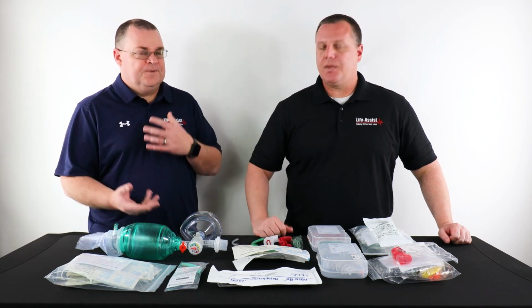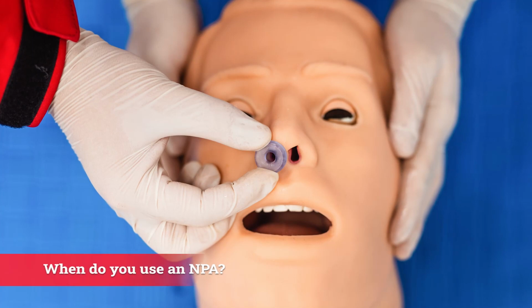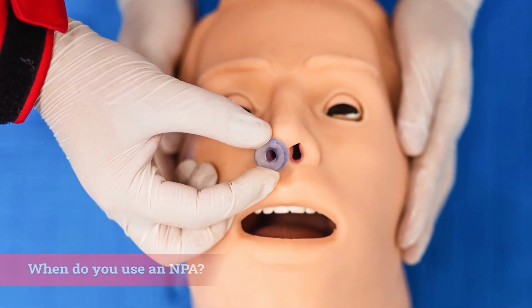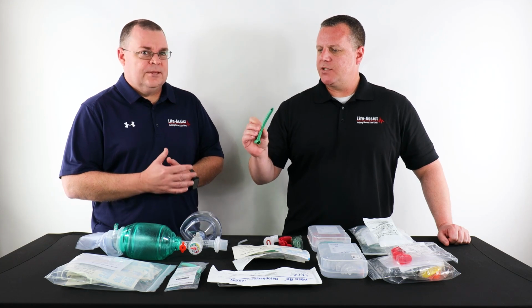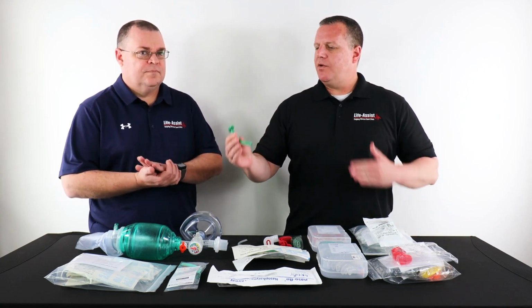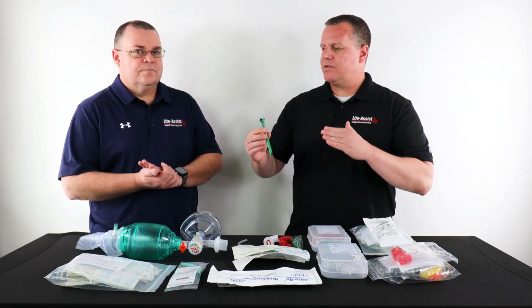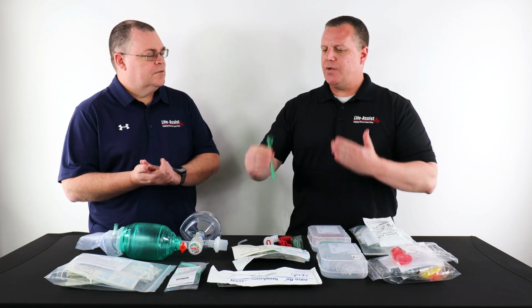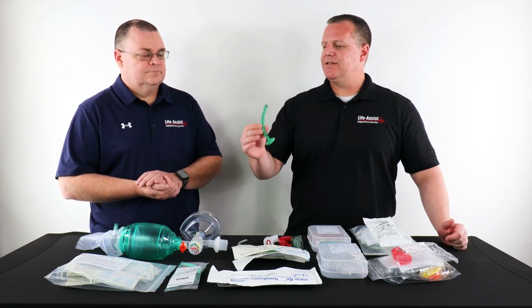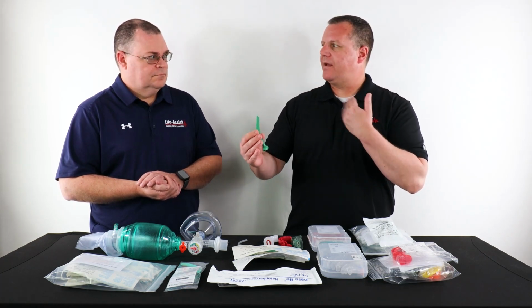So it's 2 different tools used in a different way. When exactly would you use an NPA over an OPA? Well, of course you can use these on unconscious patients as well. But the cool thing is that these can also be used for someone who's heavily sedated or semi-conscious, like someone who overdosed or has acute alcohol intoxication, because this is not really going to activate the gag reflex.